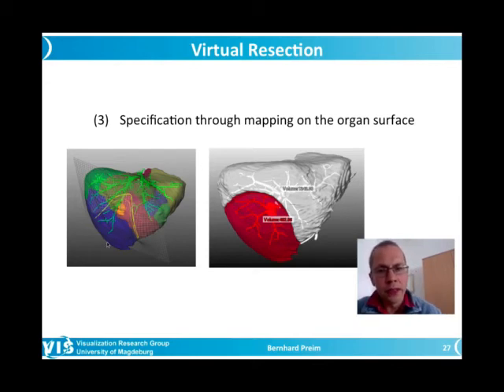And if the user is ready, not only the resection volume, of course, is shown visually, but also quantitative information is derived, like the volume here would be 482 milliliter and 1246 would remain in the donor. Yeah, would remain in the patient. So that is tumor surgery. Here we don't have a donor and a recipient. Here we just have one person, and that is the removed area.